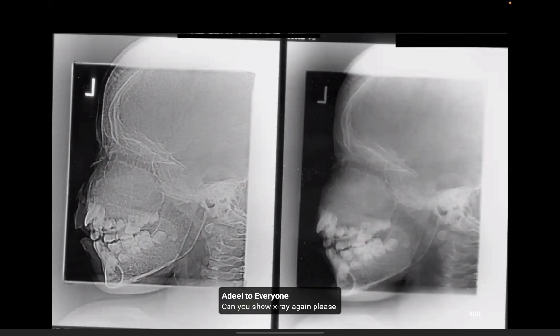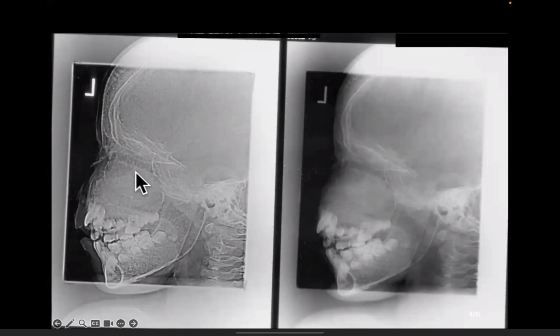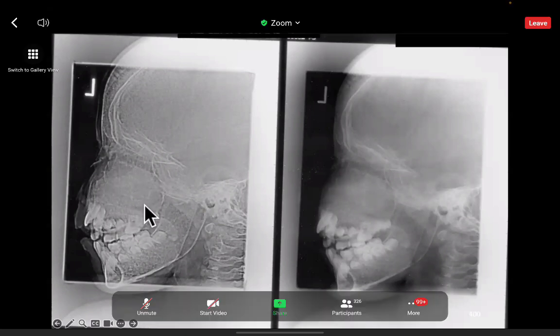Thalassemia, more of it. We've got extramedullary hematopoiesis in the maxillary sinuses. So you've lost the air in the maxillary sinuses. And you've got the inner table and the outer table, which are further apart due to diploic expansion.